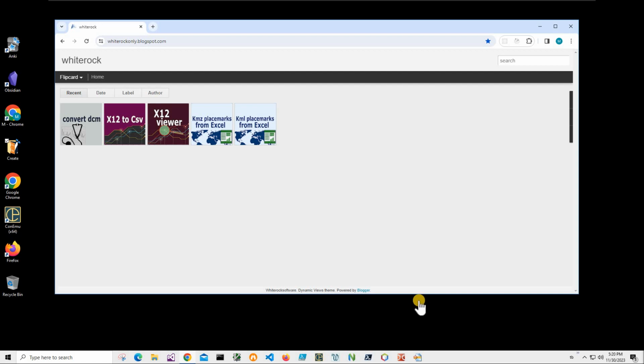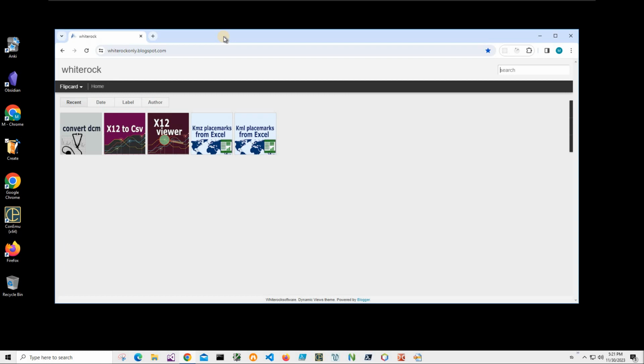Hi, this is a quick video tutorial in which I will show how to use a converter from DCM file to PNG. So first, to install the converter, I will download it and install it from this website.